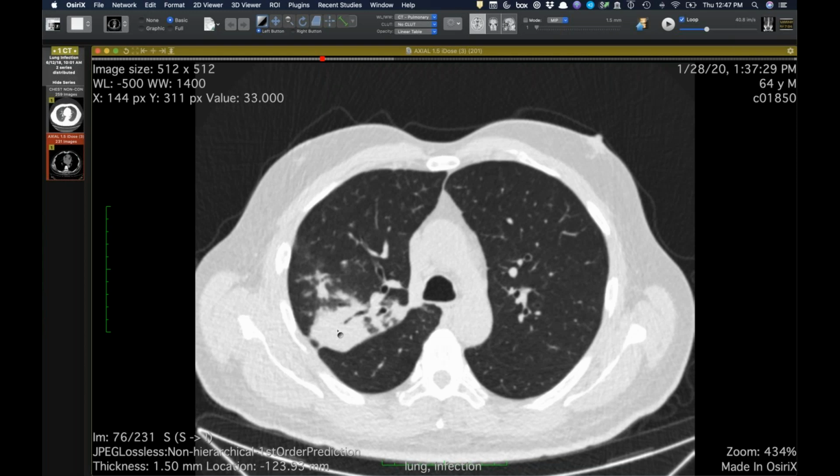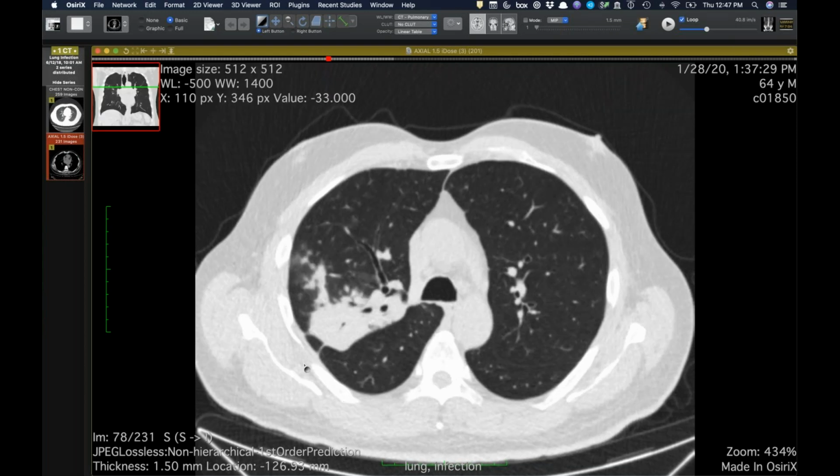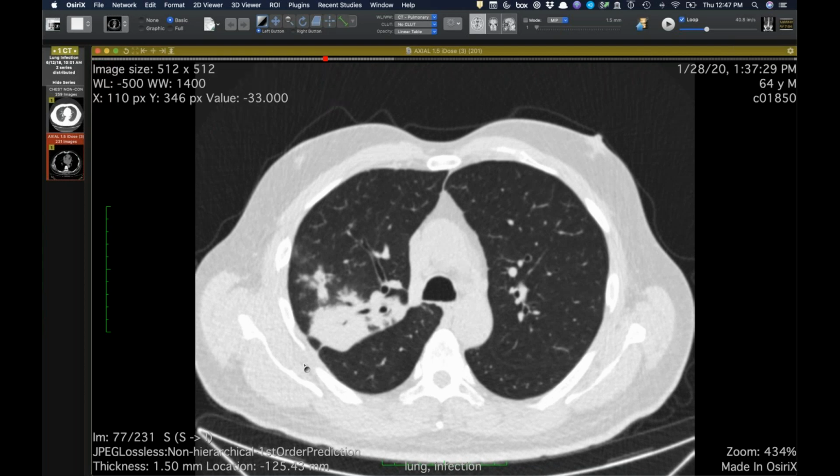So Jeff, would you call this a 2S or a 0? Well, that's what I was asking. I would probably call it a 2S and say it's, like you said, probably infection. And they're going to get follow-up, so they're really not going to get back in the screening cycle for some time. It's not like I'm going to say they're going to get a CT in a year from now. I mean, they're going to get at least chest radiographs or something, because that's not an insignificant little infection you got there. But right. Yeah. But see, Lung-RADS assumes that you're only dealing with cancer, yes or no or maybe, and it doesn't address other lung findings.